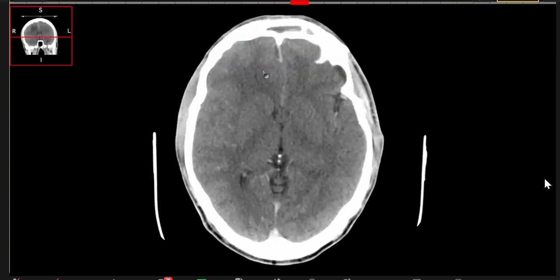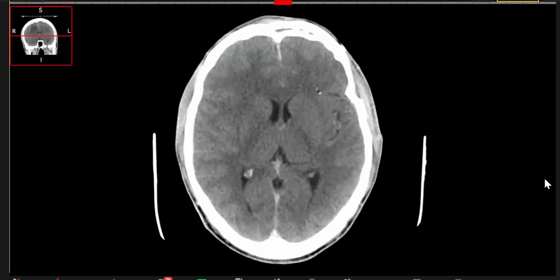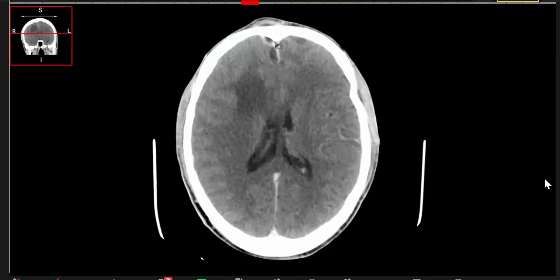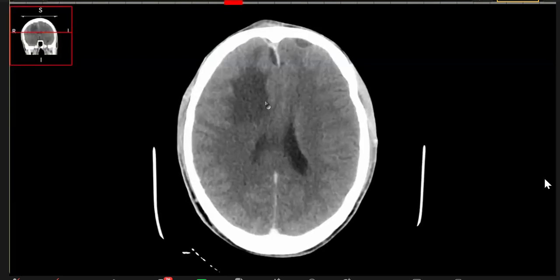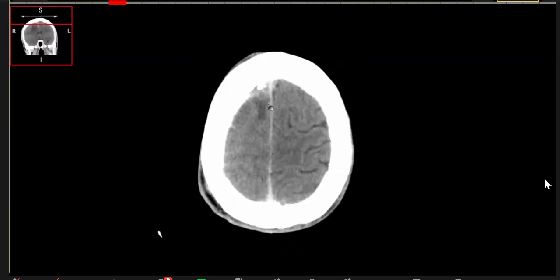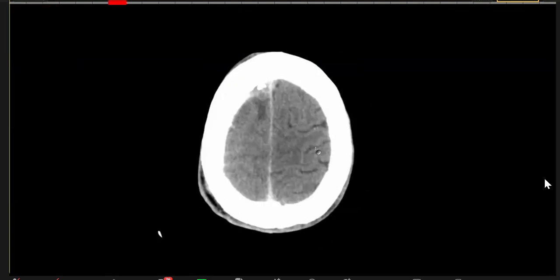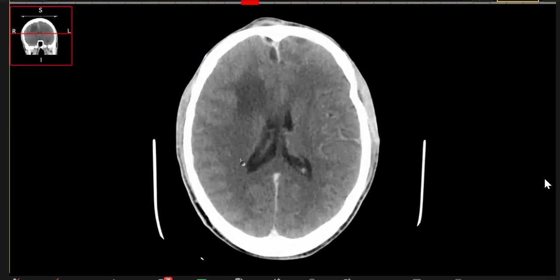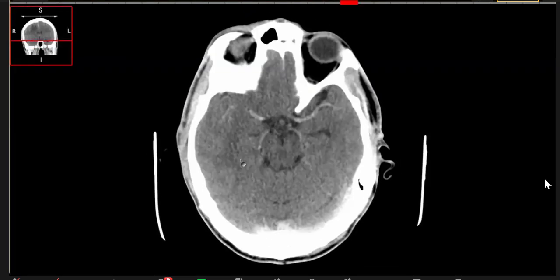So now you can see on a CT scan. Develop your eyes, forget about the burr hole, these are slightly more advanced findings, but you can see this epidural abscess here. You can see this epidural here. You can see this, and this is of course parenchyma. And if we see the edema part, you remember what I was showing you on the FLAIR sequence. Look at these sulci, look how they are effaced, and you see this enhancement. So there is a bit of leptomeningeal enhancement also. So this is a good case, a classical exam case.